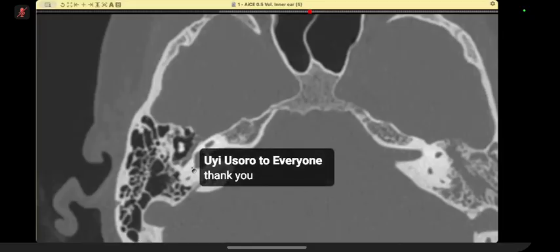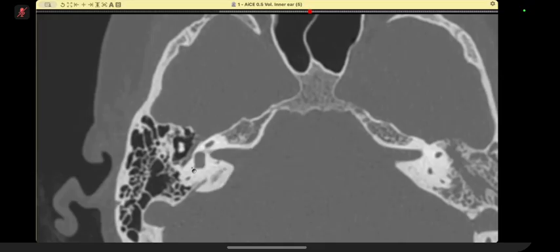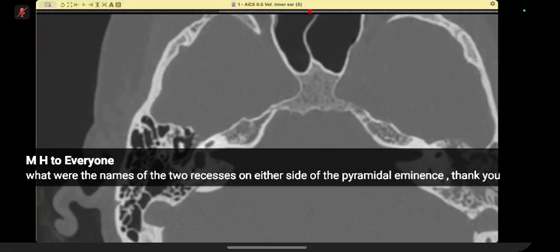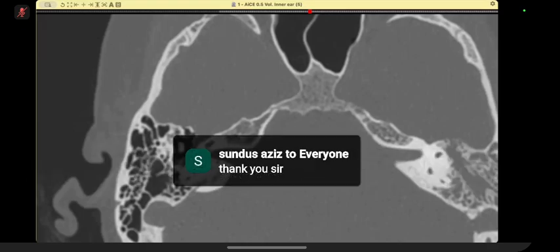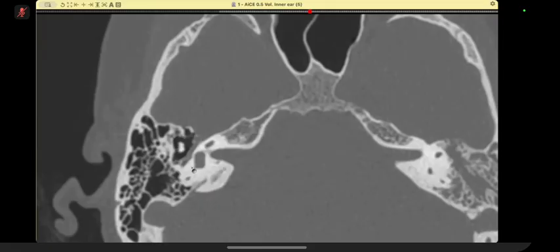Please remember that. The vascularity is very poor, and that is why if we want to do contrast MR, we do it with a 45-minute delay. Why do we do a 45-minute delay? Because the blood supply is so poor. On the other hand, a meningioma, which I showed you, will enhance very, very profusely.